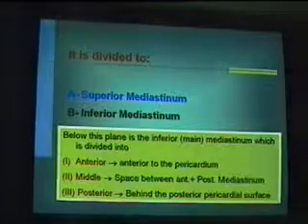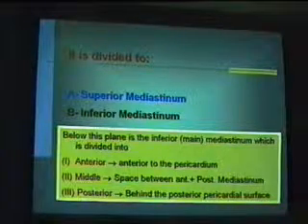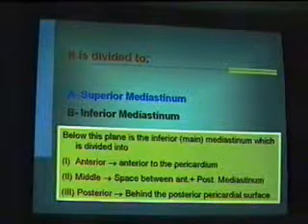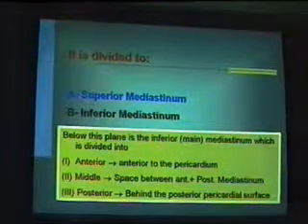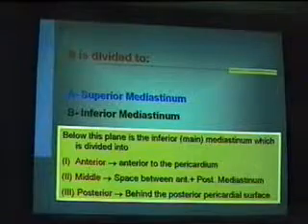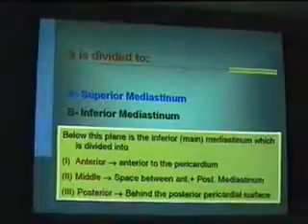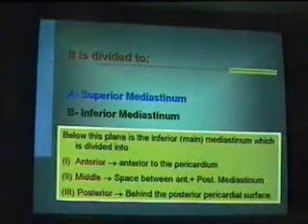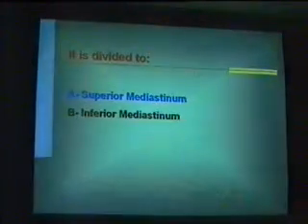تاني it's the irregular space between the medial aspects of the parietal pleura. شكلها irregular ملوش شكل معين وبتextend from the sternum anteriorly backwards لغاية الدورس. بنقسمها إلى جزء هامشي superior وجزء أساسي inferior. والسوبيريور والانفيريور دول بإيه تاني؟ ببلين بجوين المانوبريوسترنال جوينت anteriorly backwards لغاية الupper border of D5 الدورسال سباين. وقلنا ان الانفيريور بنقسمها للاجزاء الثلاثه دول.